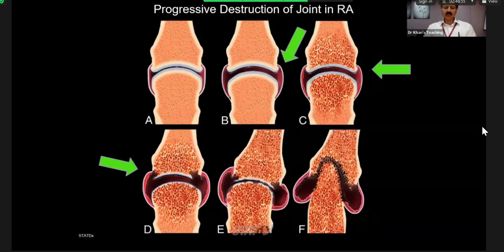And classically, if you go back to your anatomy and see if this is the metacarpal or if this is the proximal phalanx, this is the capsule. This area is known as the bare area, B-A-R-E, as a naked area. And classically, erosions are here, first of all. So this is the bare area, and the bare area is larger on the proximal aspect of the joint.